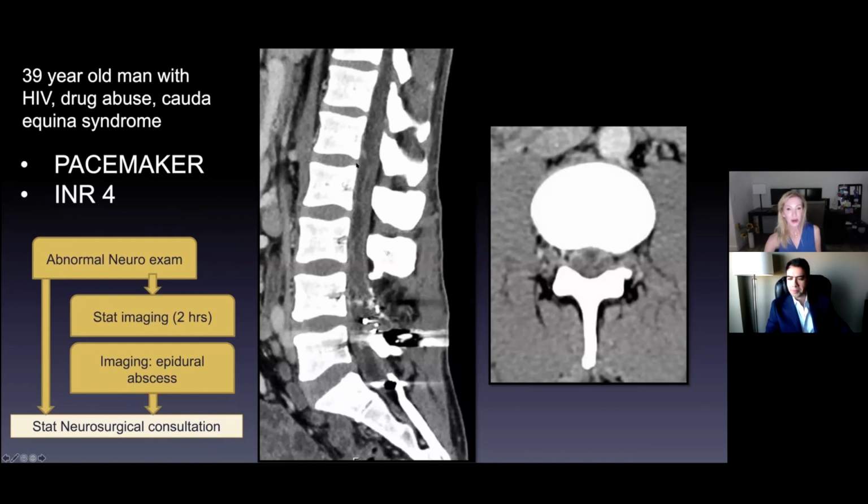And I'll just show you what this shows. There's this little squiggly line. You can still see my arrow, right? Since it's changed back from the pen. John, yes, can you see my arrow? Okay. This little squiggly line of enhancement is actually a huge epidural abscess.